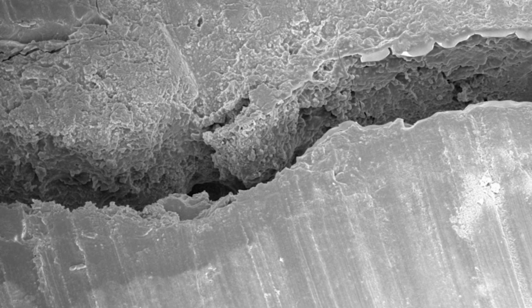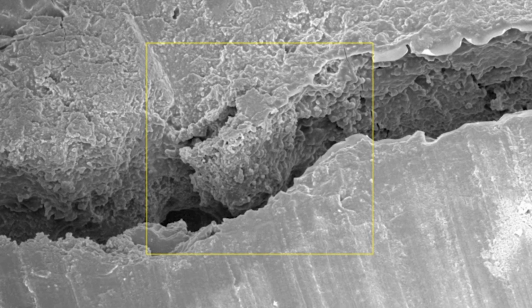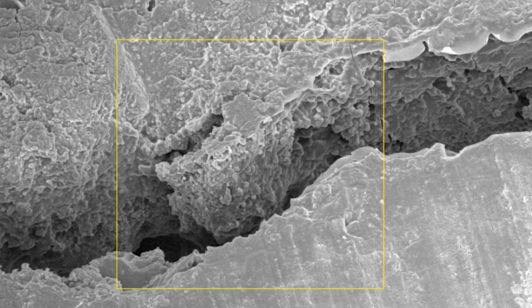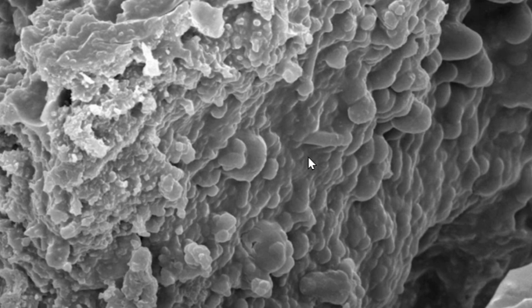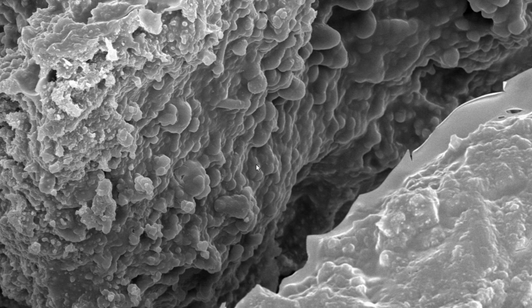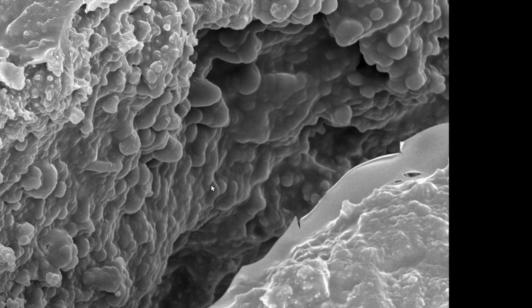Here you can see we can examine the axial wall of where the split is. After it's been dried out by electron microscopy, it opens the root up a little bit. When you go in at high magnification and look at the wall, you can see a biofilm phenotype being expressed here, a lot of EPS, and what appears to be mostly fungal growth.